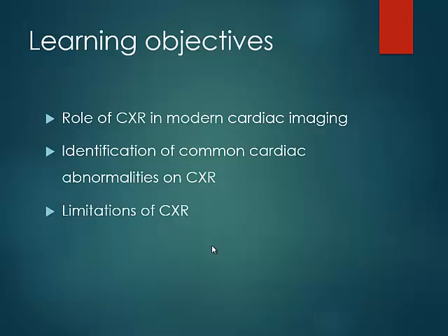So we'll try to understand the role of chest X-ray in today's modern cardiac imaging. We look at the different common abnormalities we can see on a chest X-ray and also understand what the limitations are.